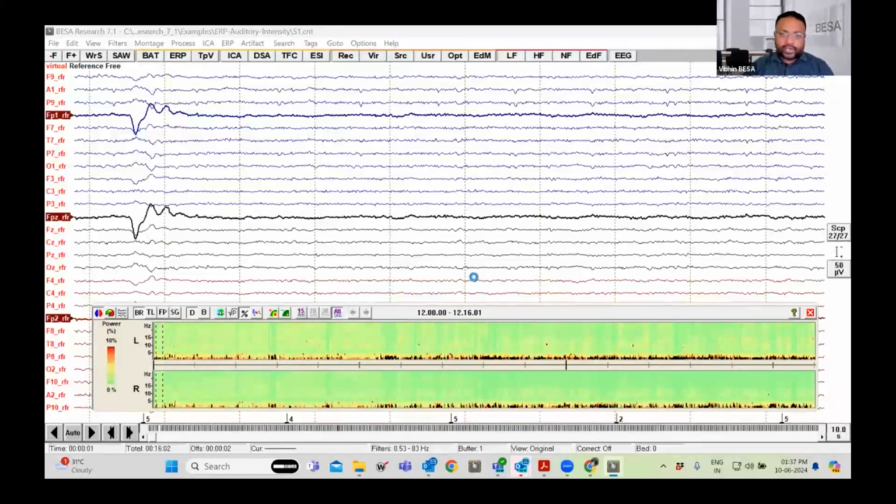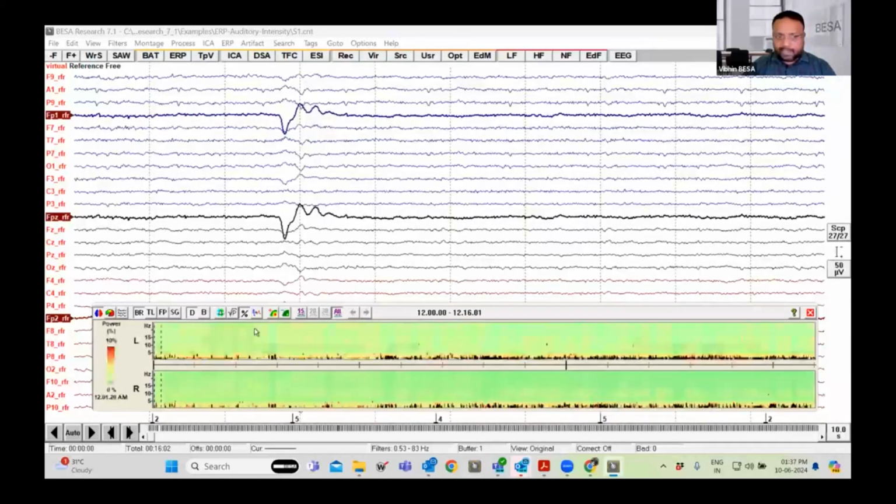Here you have the whole data, and depending on the quality of your data or the content of your data, you might see the variation in the spectrum of the data. So this would be very useful for those clinical users who have seizures recorded in the data. This would be one of the main usages wherein the doctor or you need not review the whole data. Directly you can go to the onset of the seizures by looking at the high amplitude that comes over there, or over any part of the data which has seizure.